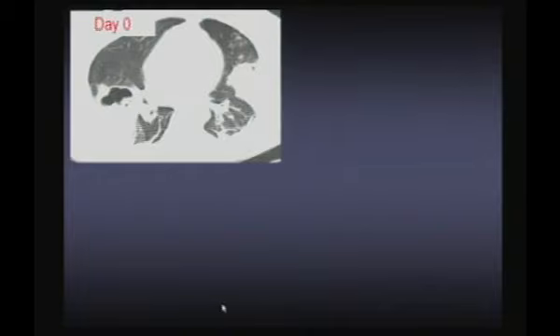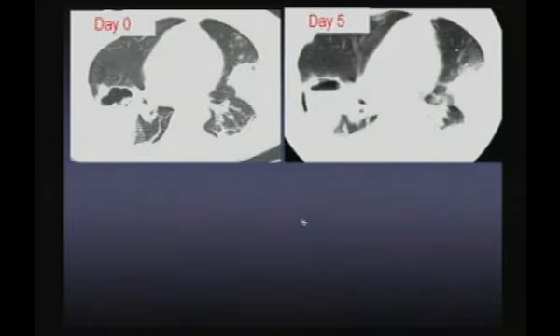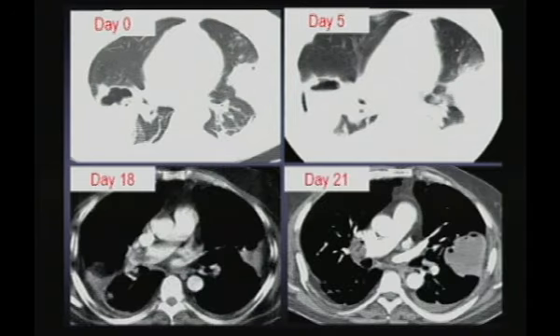Now, knowledge of these signs can be very important. This is a patient who had HIV, who had complex pleuroparenchymal cavitary disease, who was not responding to intravenous broad-spectrum antibiotics. At 5 days, he had pigtail catheter insertion into these cavities, and it was only several days later on an initial contrast-enhanced study and then a dedicated examination that it was clear that these findings were due to cavitary thromboembolic disease, and the patient recovered with anticoagulation alone.